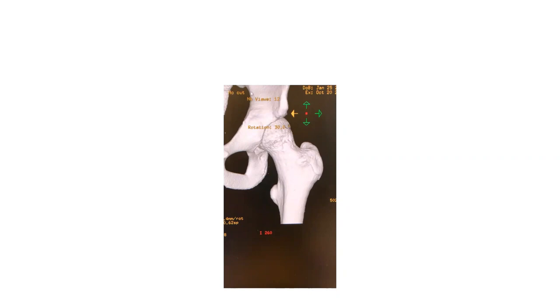There are devices that go inside the hollow part of the bone, in the medullary canal, and those are called nails. There are devices that go on the outside, like you see here, those that have screws going through them. Those are called plates. There are external fixators, which sit outside the body and have pins going into the skin. We use pins sometimes to hold things in place.